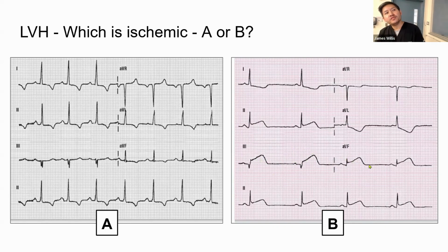These are definitely hyperacute T waves, but also, I mean, ST elevations too. Yeah. So very tall compared to the QRS complex. It's like these are essentially tombstone. Yeah, exactly.